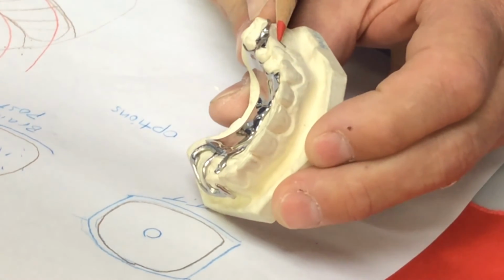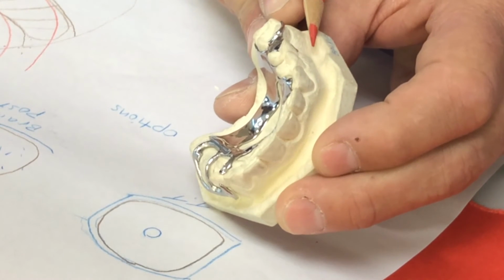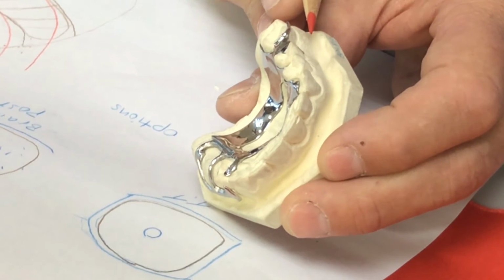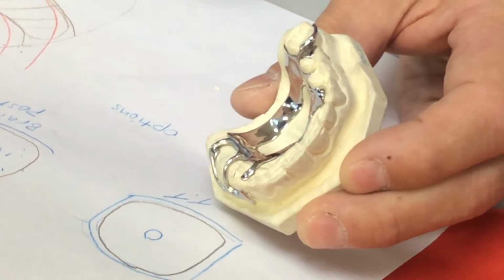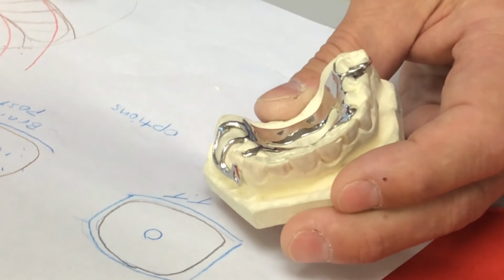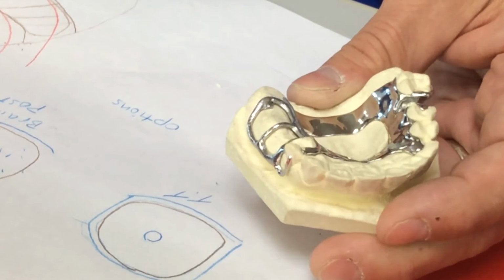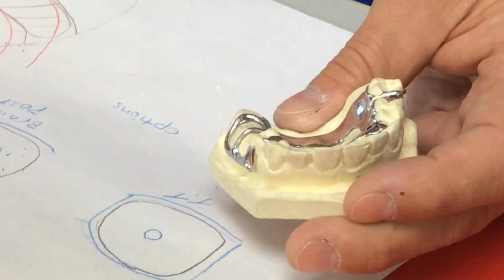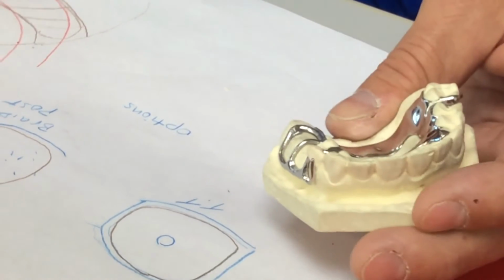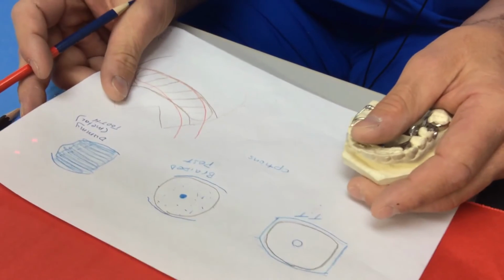Dr. Smith has this all thinned out because he took acrylic and would put it down here and make a little acrylic flange. Tooth bound, he wouldn't extend it to the vestibule, but he would put some acrylic there. In normal circumstances, the tube tooth does not have any acrylic there. You would have to special order that and tell your lab that you needed acrylic there because you were using tube tooth in an aesthetic situation, and for some reason you wanted to cover that metal and have acrylic there. The other choice that you have for this place is the braided post.